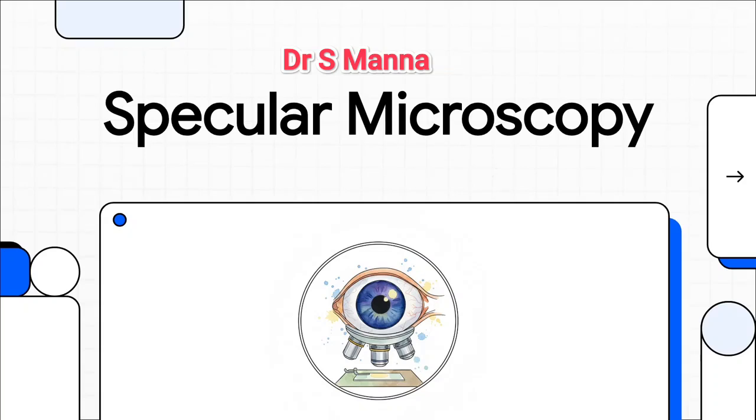I'm thrilled to have all you clinical students and future eye care professionals here today. We are jumping straight into a clinical review that is absolutely crucial for your practice, mastering specular microscopy and diagnosing corneal endothelial diseases. If you've ever stared at a patient's scan and just wondered how on earth to interpret those tiny, chaotic cellular patterns, well, you're in the exact right place. We're going to decode all that imagery together, step by step.